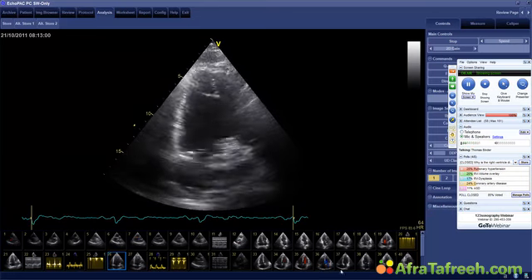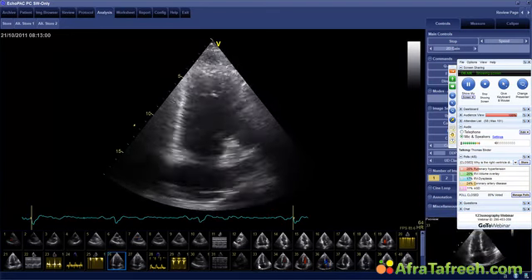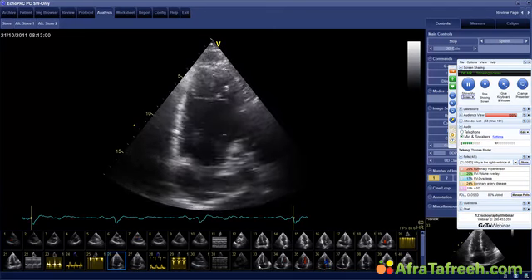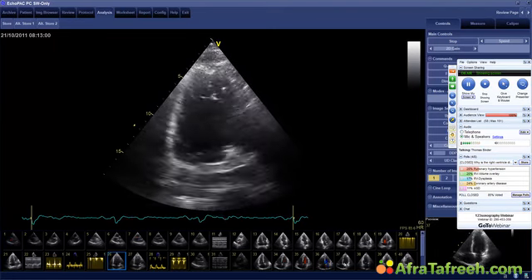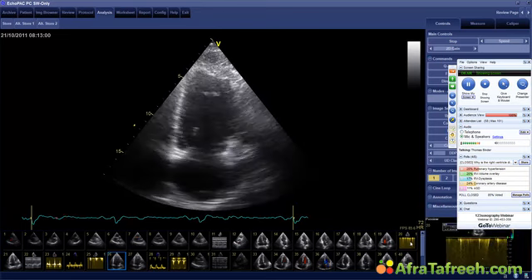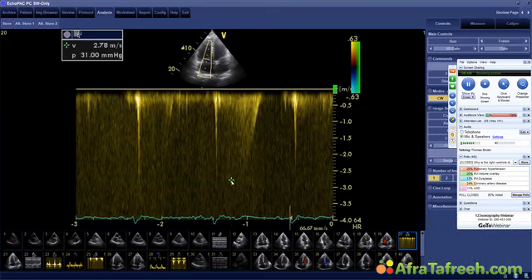Symptoms that you have with right ventricular infarcts typically are hypotension, fatigue, and right ventricular failure. In other words, you would start to see edema of the legs and pleural effusion and so forth and so on. Why do I not think that this is caused by pulmonary hypertension? Well, one thing is, of course, the signal, but you might say, okay, this signal is not good enough for you to believe that there not truly is pulmonary hypertension.